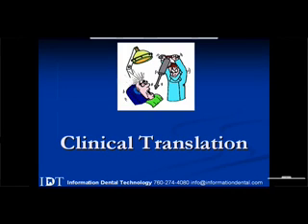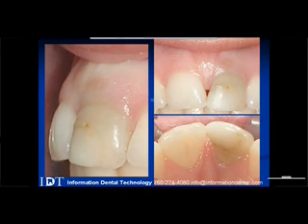Another one is that clinical translation, being able to read and interpret what you're looking at from the CT scans and being able to navigate through the software program. I'm not sure how many of you use cone beam that much, but this is some of the clinical translations that we've seen. This is tooth number 9, patient is asymptomatic, looking for cosmetic resolution, probing depth is normal, full screening is fine.